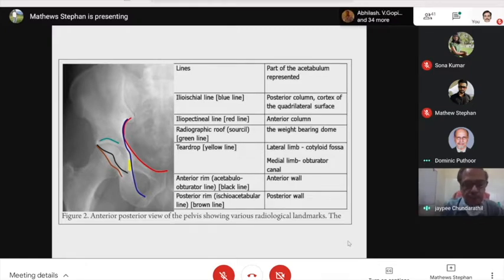of the pelvis with both hips, AP view. Never be satisfied with an X-ray of one hip. You may not be able to make out a pathology without seeing the so-called normal hip on the other side. That's very important. And then you should see at least the proximal third of the femur, not just at the level of the lesser trochanter.